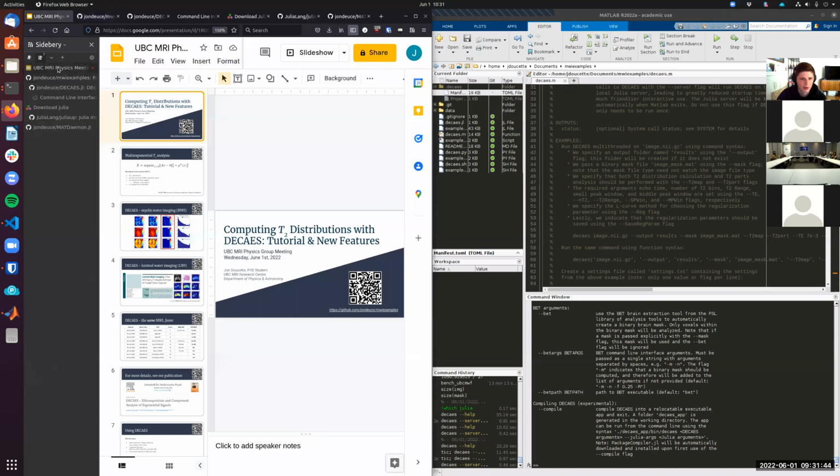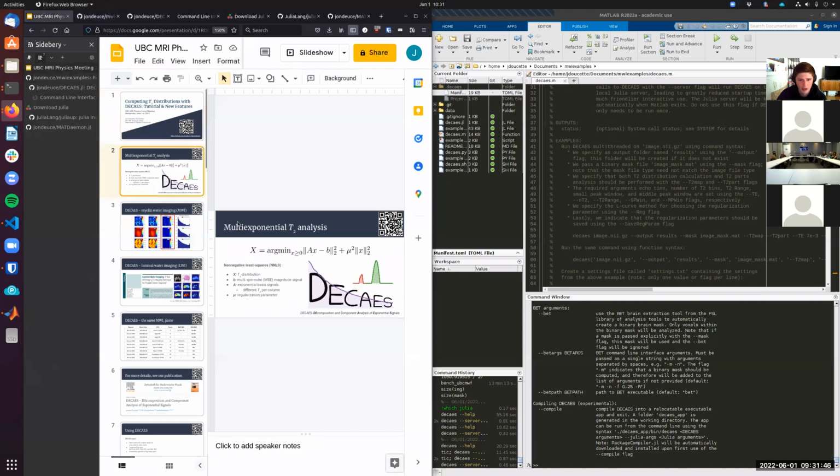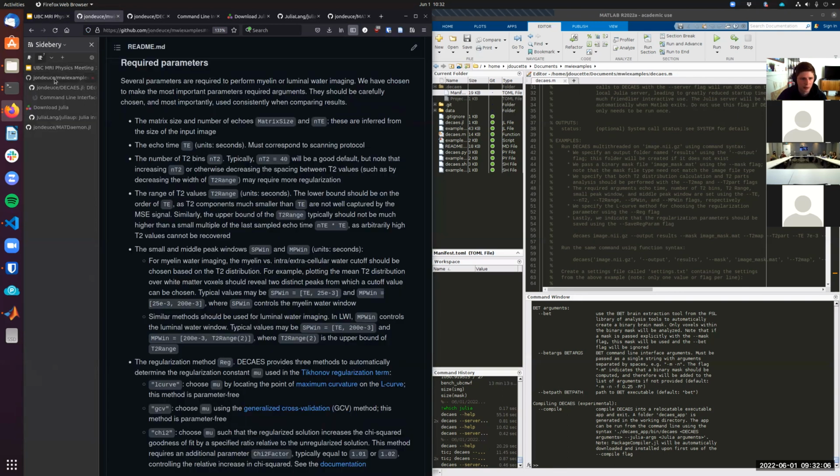And just to go back to the animation here to get something. The number of components will essentially be the discretization of this distribution here. So basically how many components there are, that's what the NT2 is. The higher that number is, the finer the resolution, but the trade-off is you have to regularize more. Again, that's done automatically, but still that's what's happening in the background.